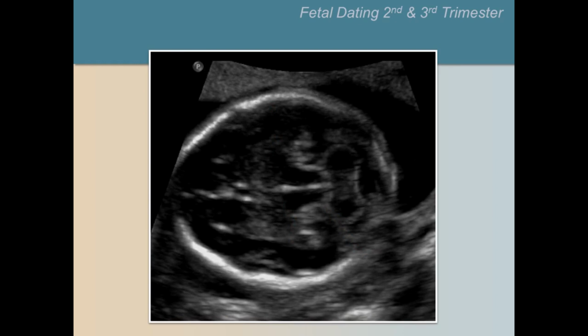Please pause the video now and ask for a participant to identify the thalamus and CSP. We have outlined the CSP and the thalamus here to make the structures more obvious. What is this structure?